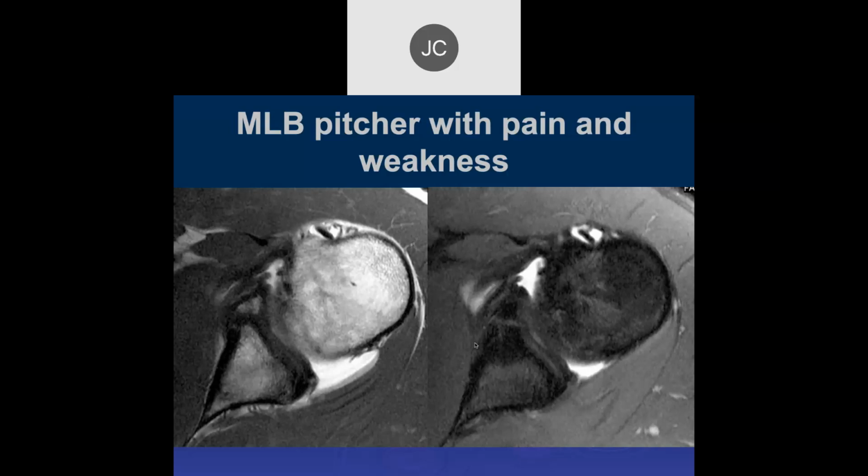So axial T1 and then PD. See a lot of just diffuse thickening of the anterior labrum most prominently, and then that posterior aspect might be a little bit blunted as well. Maybe a little bit blunted, yeah. And so what do you think's going on out here? Um, the labrum likely tore and then was displaced anteriorly, and then there's probably some scarring down. So you think this is the labrum here? Yeah. What's this high signal intensity in it?